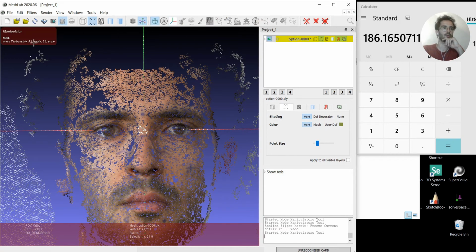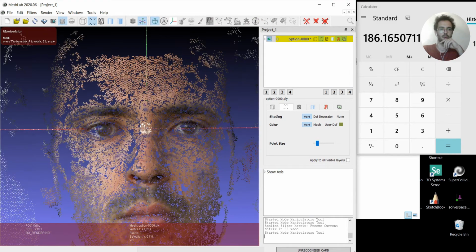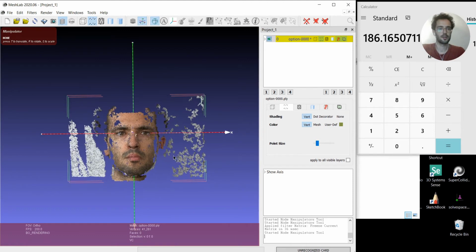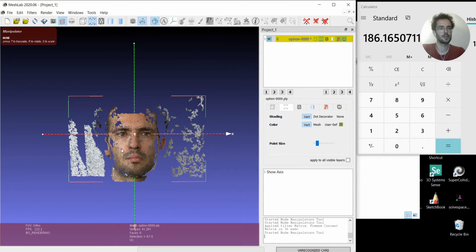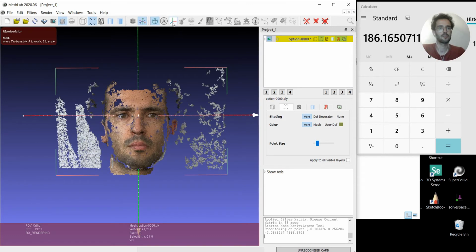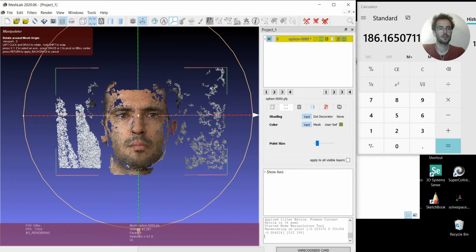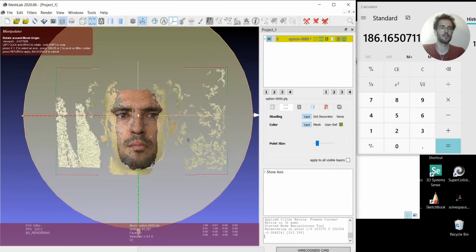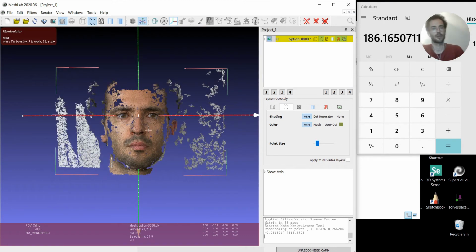This will apply the transformation to our tool. So when we switch back to rotate again, you will see that it's not going inside the rotate action. Okay, right now it worked. You can see the origin of the rotation now, it's the center. So it's my origin. I needed to apply the transformation for this to happen.